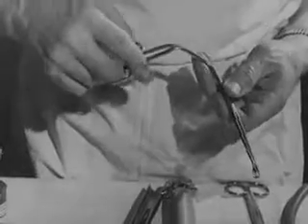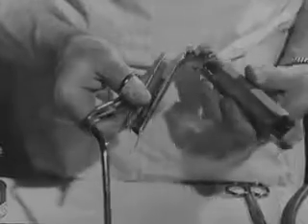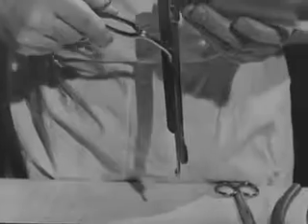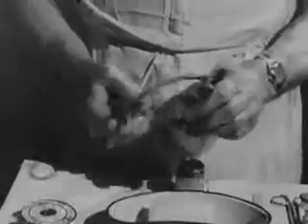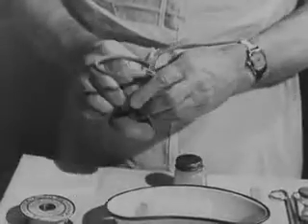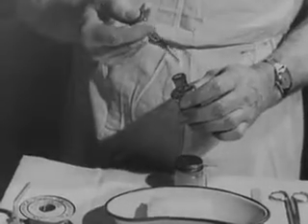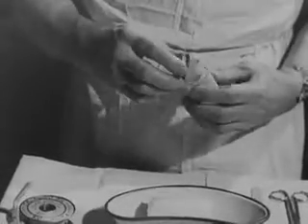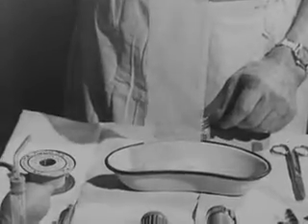Angulated forceps. These are necessary for packing the throat with gauze and also to assist nasotracheal intubation. They are so constructed that the hand holding them does not obscure the field of vision. A spray for applying a surface anesthetic to the patient's throat. A drop bottle containing an ephedrine paraffin preparation for use before nasal intubation. A lubricant for the endotracheal tubes, and a roll of gauze impregnated with liquid paraffin.